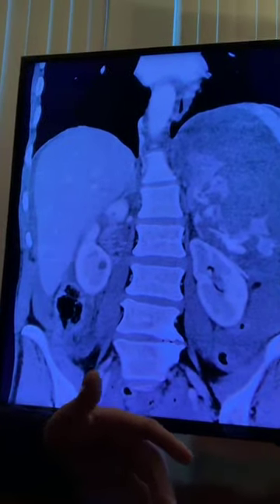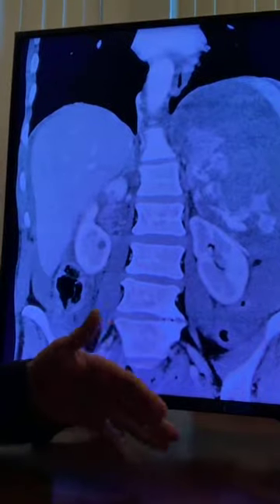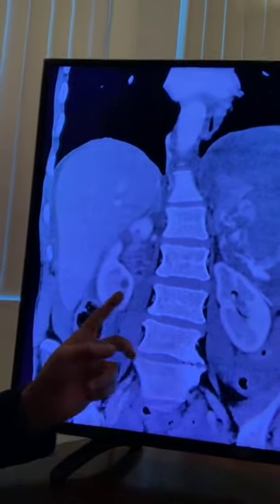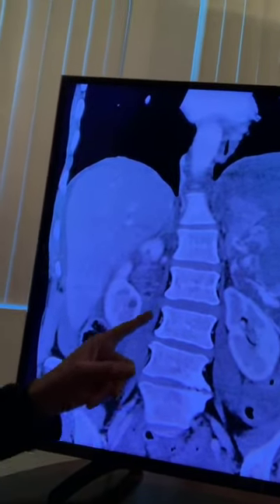Now you have to figure out, all right, well, is this an axial cut? Is this a coronal cut or a sagittal cut? I love doing this. Axial this way, coronal this way, sagittal this way. So going back here, which way is this? This is coronal. This is how you're going to answer every one of these questions if you're in case conference, if you're a radiology resident. I would start off by saying, well, I have a coronal cut, a contrast enhanced CT examination. It's at the level kind of posteriorly where the kidneys are. What other organs do we see? We see the liver here. We see kidney. Anybody know what these are right here? Anyone?